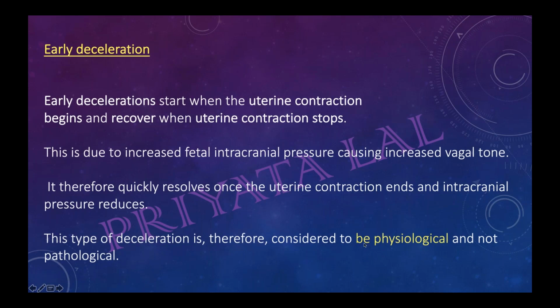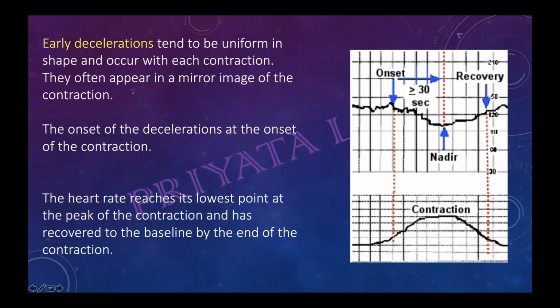These types of decelerations are considered physiological. These are not pathological. So if early decelerations are there, we are not worried. Now these are early decelerations.